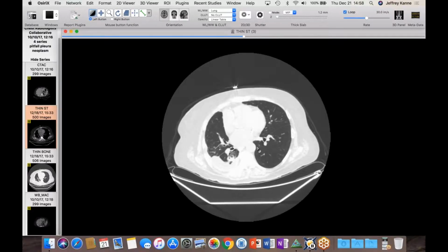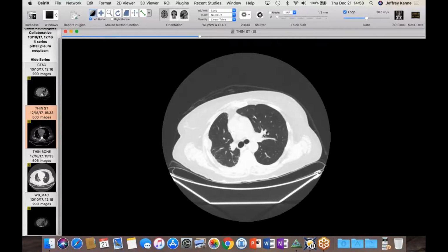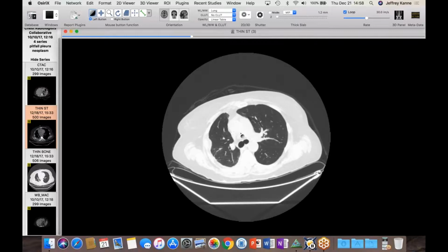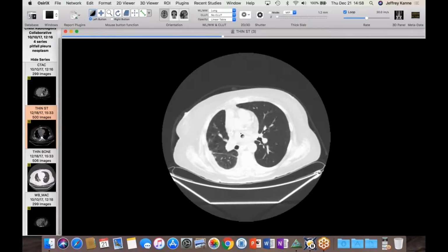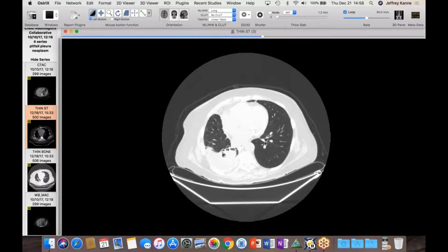In talking this morning, one of my colleagues, Chris Meyer, commented that everyone he seems to know has seen at least one case of this. So it's always kind of, how do you manage it? This case has some other clues, but they're subtle. And when you have a lot of pleural stuff going on, it can be tough to determine what's going on. So yeah, I've always reported it as rounded atelectasis as well.